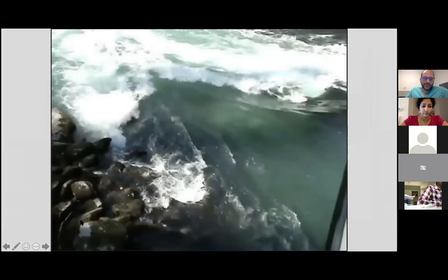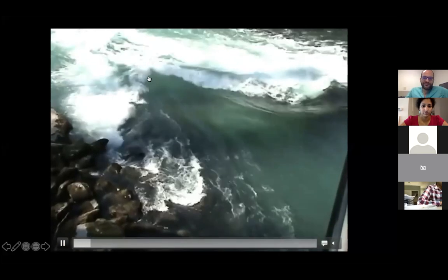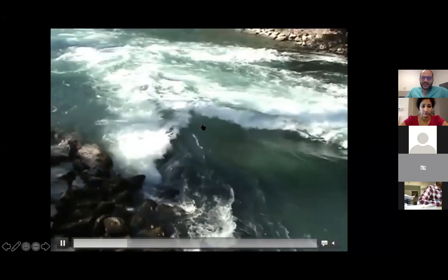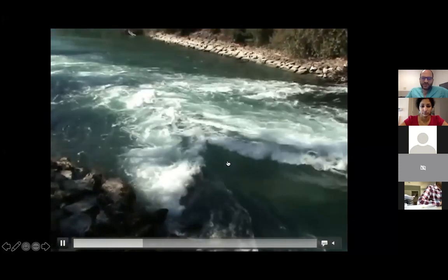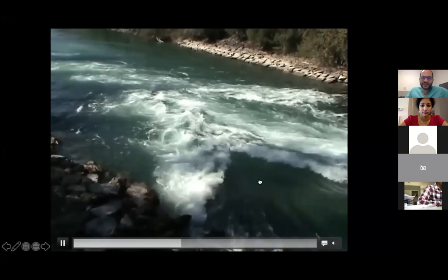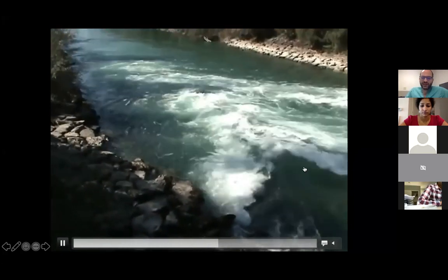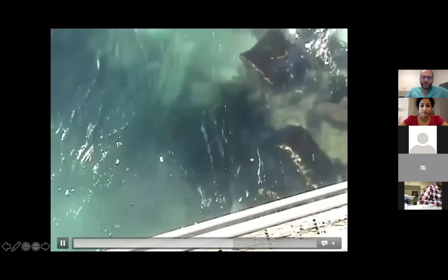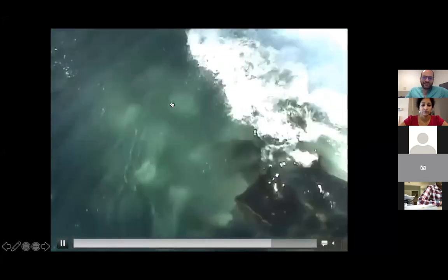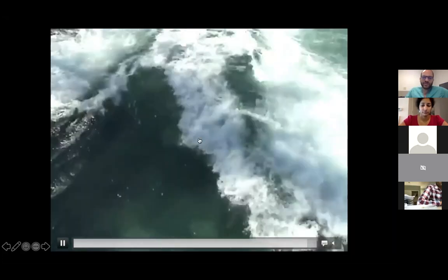And so, we can see this in a river. At a stenosis, at the narrowest portion, you actually get plug waveform. Everything goes the exact same velocity. And so when you look at an area of stenosis, or an area of narrowing within the river, and you look at the bottom, you can actually have the most clear vision of what's going on underneath the river. You can see the rocks really nicely right at the area of the stenosis because of this plug waveform. Here you can see that this is the highest velocity here, but at the stenosis, everything is nice and clear. You get plug waveform, and then distal to the stenosis, you're going to get this turbulence going on.